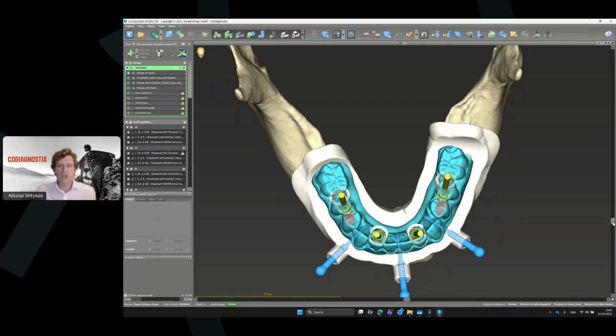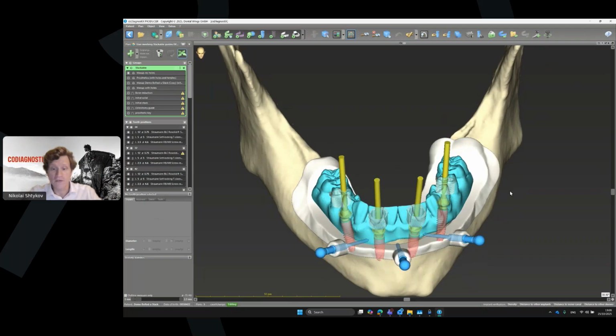Or if you're using another software for planning, you can use CareVisual, Lexicad, 3Shape, whatever you want. You can make your first planning, even using wax and plastic teeth and then scan them. So everything works. Then you have this scan, and you use it for your planning.